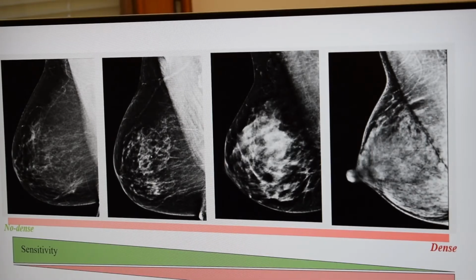We, the researchers from the University of Eastern Finland in collaboration with the Kuopio University Hospital, are interested in working on the breast density assessment. So usually the mammograms are used for the breast screening purpose in order to estimate the breast density. For instance, if you see in this picture, we have 4 different categories of mammogram. The first picture is the very less dense breast.